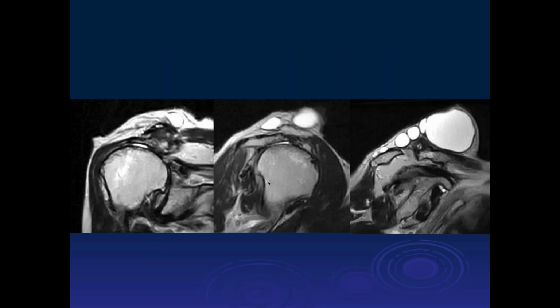Well, with the supraspinatus muscle mass, it looks like this fellow is doing a lot of exercise. So maybe he should slow down a little bit. Yeah, maybe so.